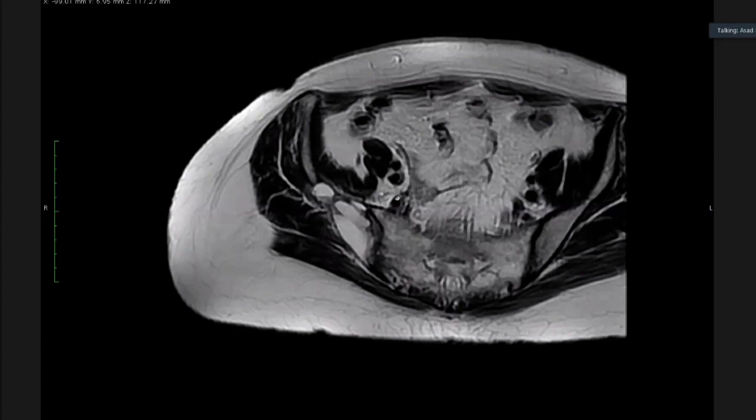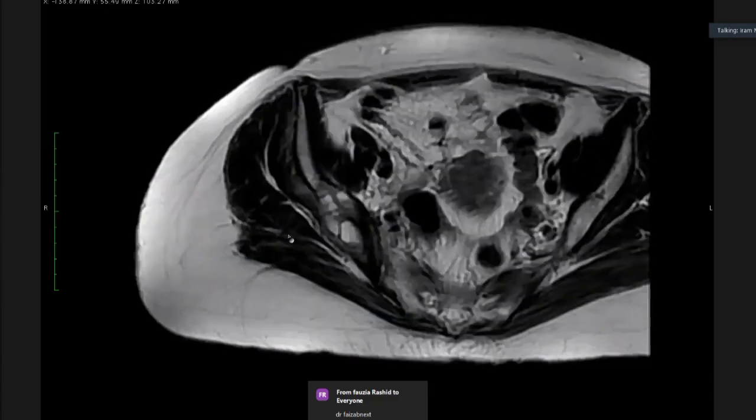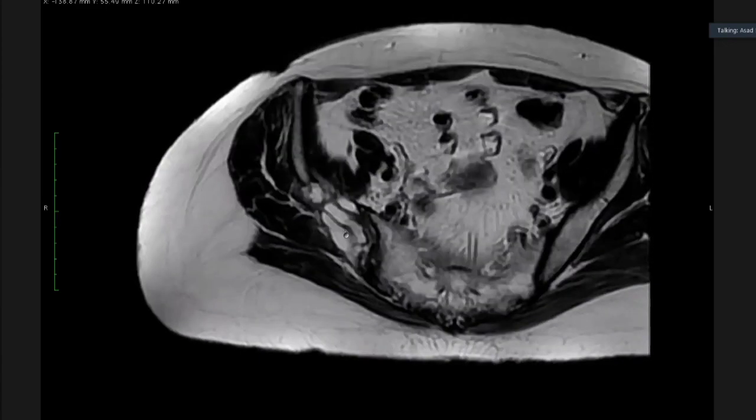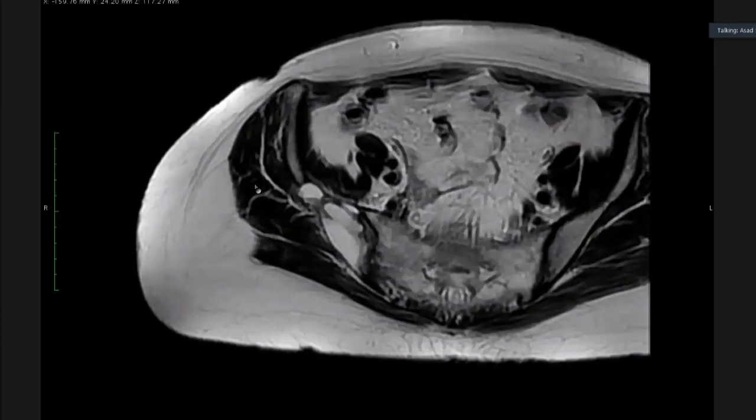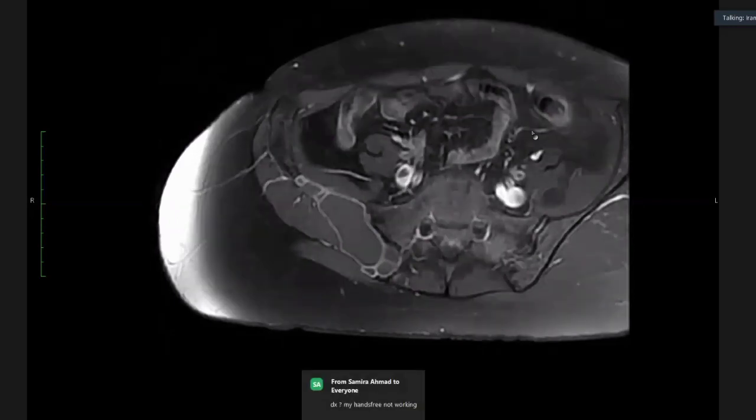But then, on that image, do you see any kind of pathognomonic feature? Yes, I can see a fluid level in one of the cystic components. And it's got these septations. I can see the septations as well. So this is multiloculated. There is avid contrast enhancement of these septations and the margins of the lesion. There are no enhancing solid components within the lesion itself.